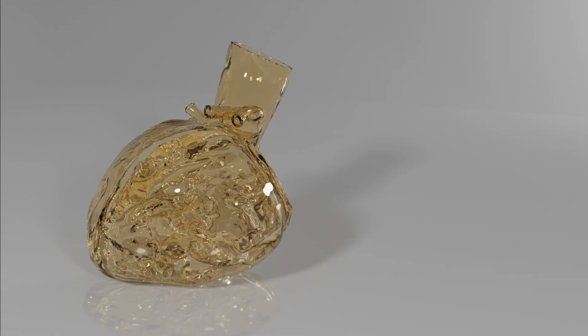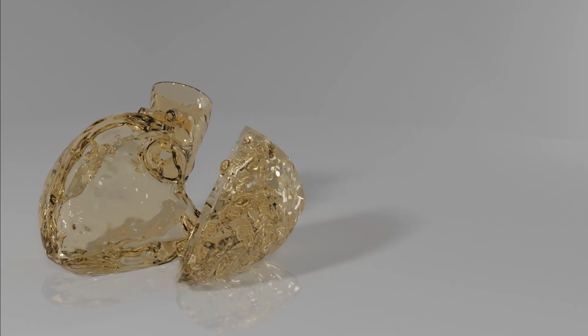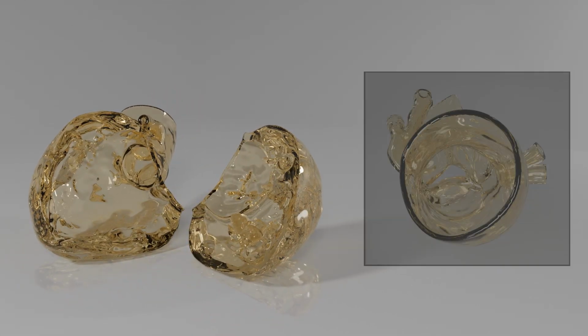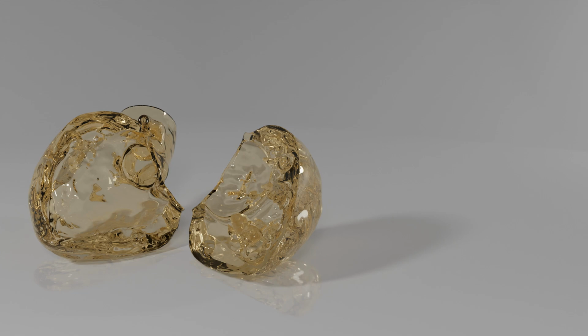To help prepare for the intervention, the cardiovascular surgical team requested a patient-specific heart model. The requirements were precise: a 1-to-1 representation of the structures of the left heart, including the left ventricle, the mitral valve, the aortic root, and the ascending aorta. In addition, the model had to be modular and allow access to the left ventricle to view the aortic valve from the inside. Soft and flexible materials were required to replicate the feel of real tissue.